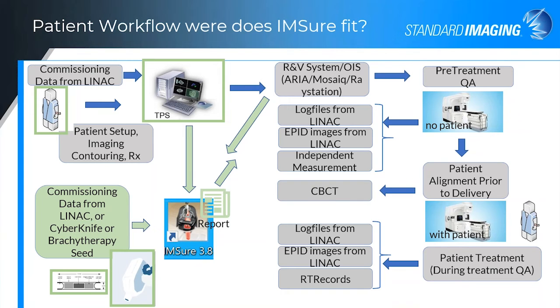Device-specific commissioning data, as well as patient-specific information, are incorporated into your TPS. Prior to use, device-specific information, be it for your Linac, traditional Linac, CyberKnife, or the consensus data for your brachytherapy seeds, are incorporated and commissioned for use in IMSure.